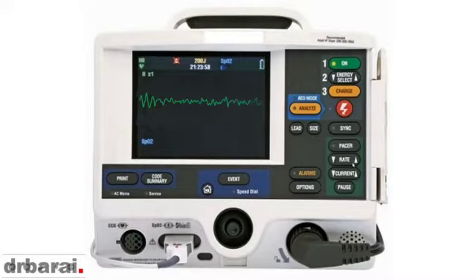For pacing, we can increase the rate, decrease the rate. We can set the amount of current that we put on, for example, increase the milliamp of current, decrease the milliamp of current. Pause button. Alarm button, we can pause it. If we want to decharge the machine, we can press this button, and there are some other buttons as well. So to keep it simple, let's get into the rhythm straight away.